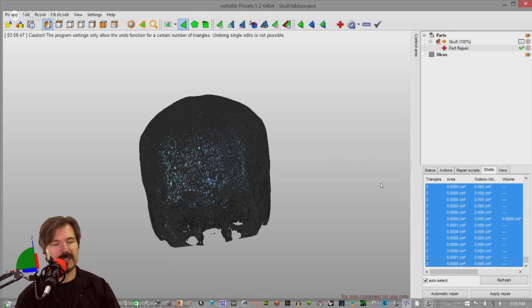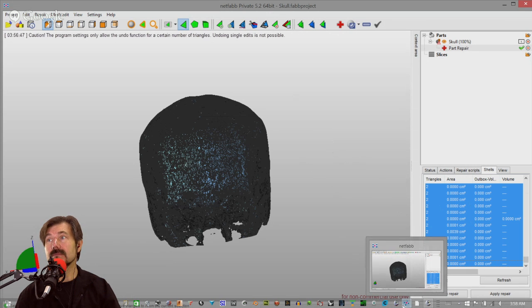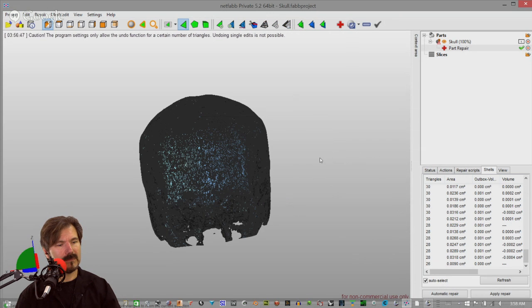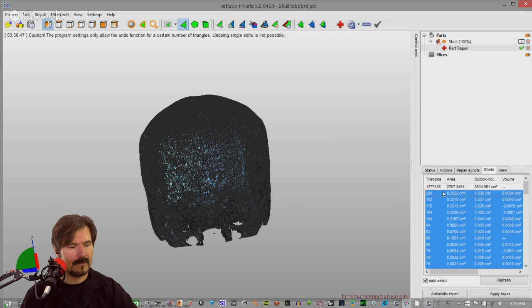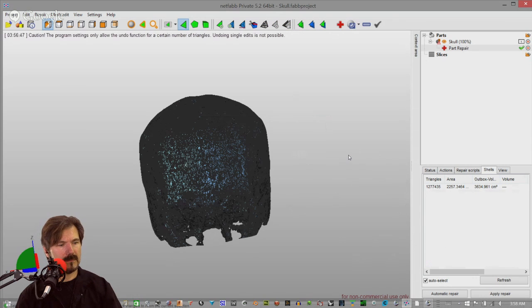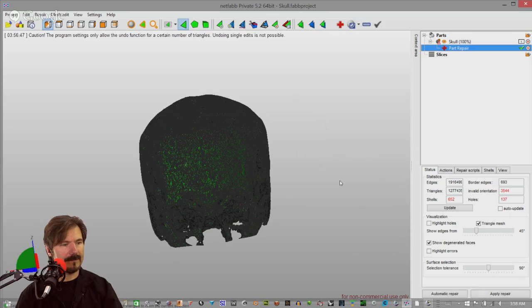See, I probably pushed it again and wasn't patient. Let's cross fingers that it does come back properly. Yay. Well, still have a few more. Okay. So we're back to just one model again.